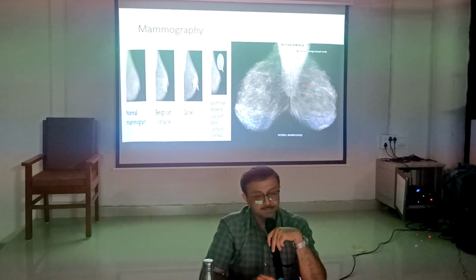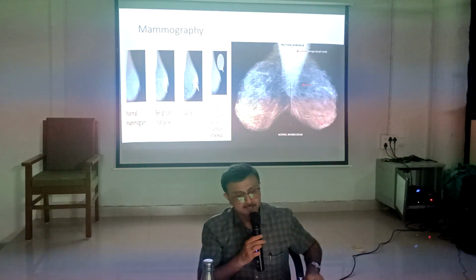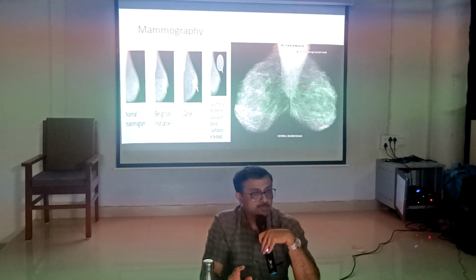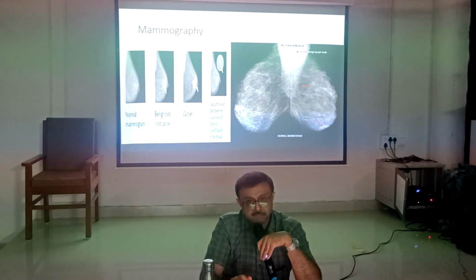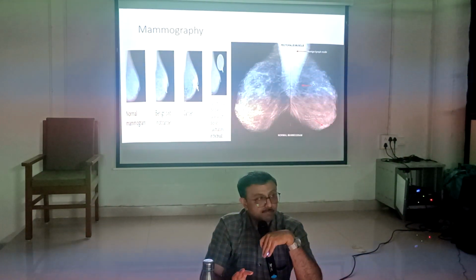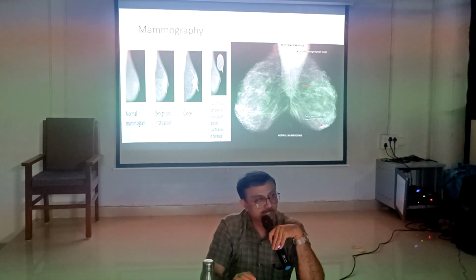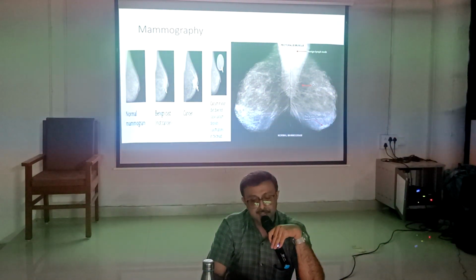Mammography. Just look at these. This is the good screening investigation for breast carcinoma, benign lesion and malignant lesion. In young females, mammography is not useful, but in middle age and old age, mammography is very useful. Microcalcifications are nicely visualized in mammography. Even MRI cannot pick up microcalcification. Normal mammogram, benign cyst: smooth, rounded, smooth surface, no spiculation. Cancer has branching and spiculation, irregular surface and calcifications.